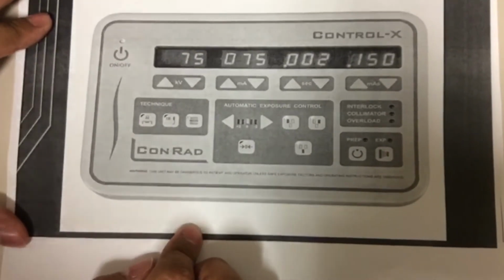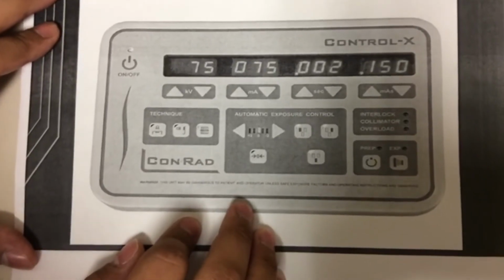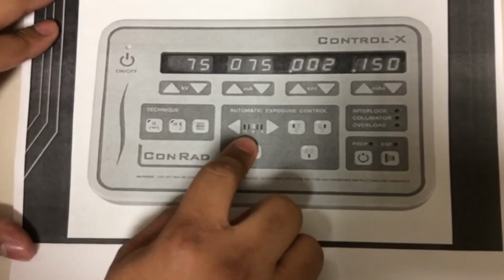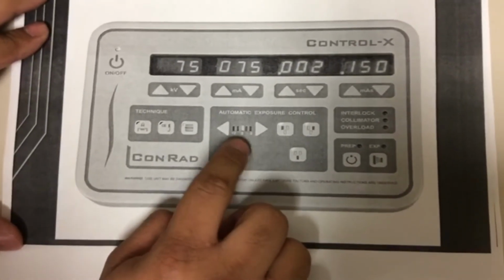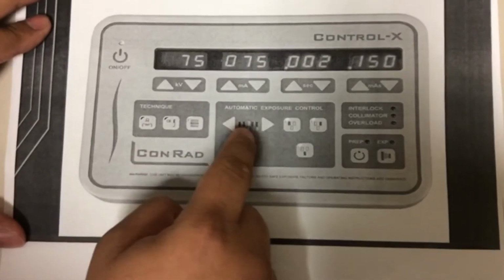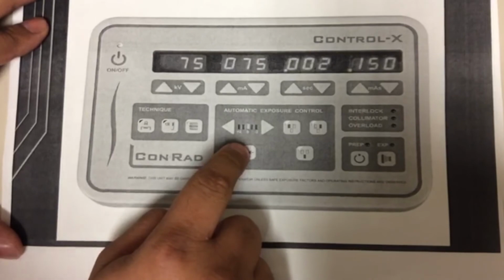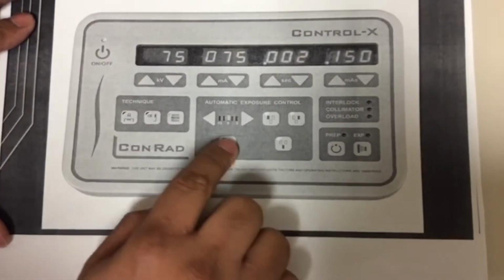Another very important thing that we can do is that you can tell the machine if you want a longer exposure. For example, you see here that you have, this is called the density control, and you have plus 2, or minus 2. So right now it's set at 0, as we can see the light in the middle. Every time you move, let's say for example to the right, let's say you would go plus 1, you're basically telling the machine that it's usually set at 25% more density than what you would normally get for whatever study it is you're doing.